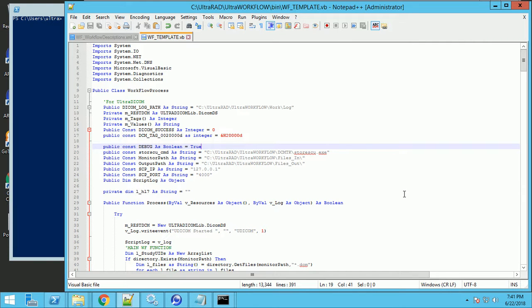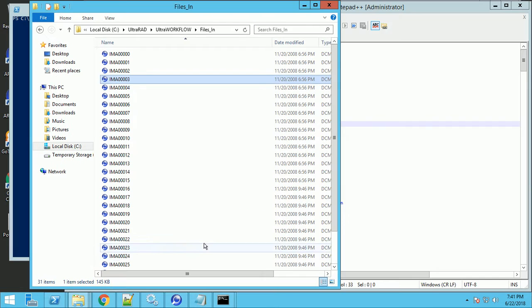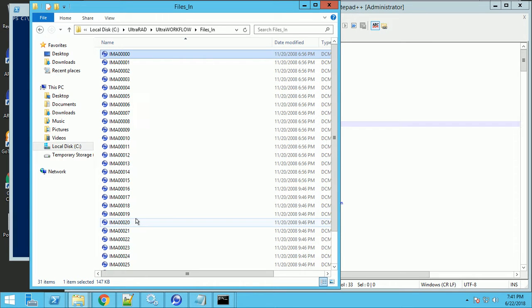So I just wanted to show you my solution to the problem that I gave you in the previous video, which was, if you recall, so here in the DICOM file, I have 30 files. Half are for one study and half are for a different study. Also, about half of them are JPEG 2000 and the other half are JPEG. So they're different transfer syntaxes and different studies.